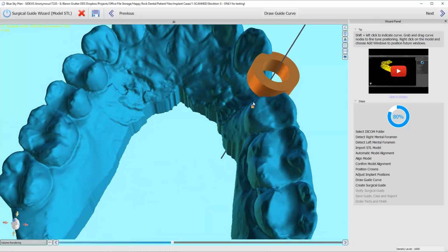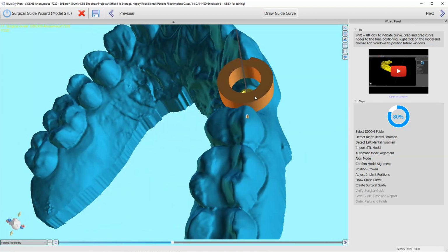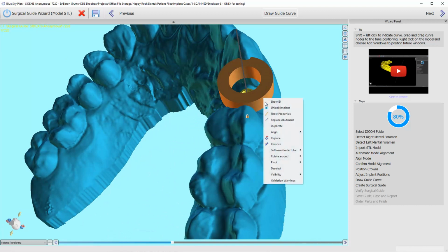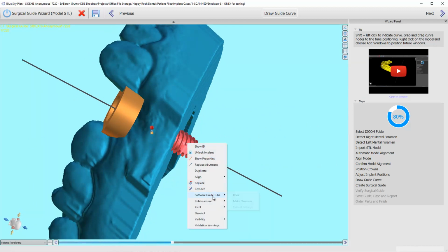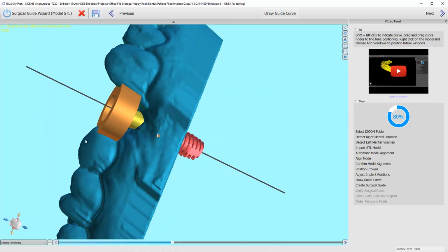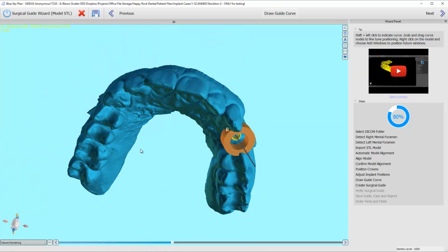So it went from the 8 mm drill that's normal, to 10 mm, which is the next step, up to an 11.5 mm drill if it really was deep or a lot of things were interfering. But I'm going to go ahead and say back to default and raise it one time. So this is where the software fixed it for us. Perfect. That's exactly what I needed to do, and I'm good there.